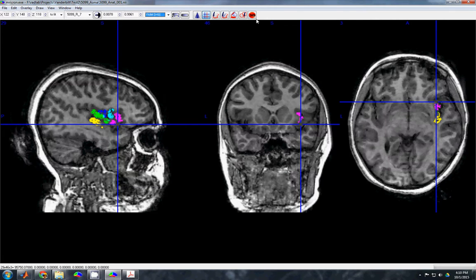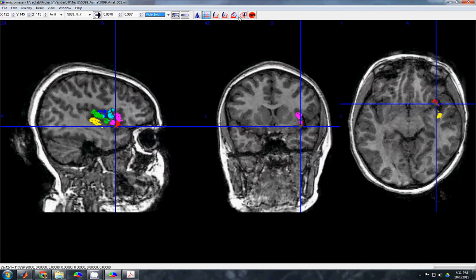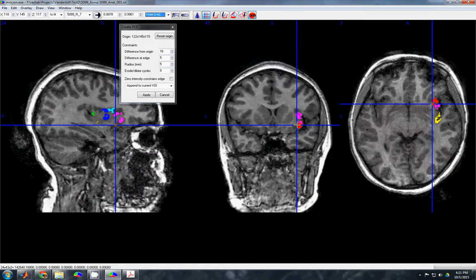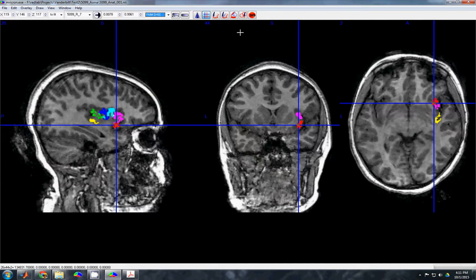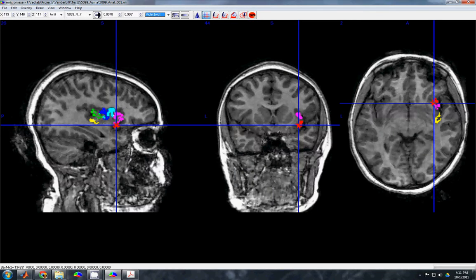And so our last one on this right side, number 8, I'm going to fill in there. Move it a bit more, fill in there. Try scrolling in, see if it ends in an appropriate place. Yeah, not bad. I might want to even get it to color in a bit more here. And then this stuff here is really more like white matter, right? I might start second guessing myself and thinking this is also a long gyrus, so I can come back to that, and I'll show you how to do that in a sec.